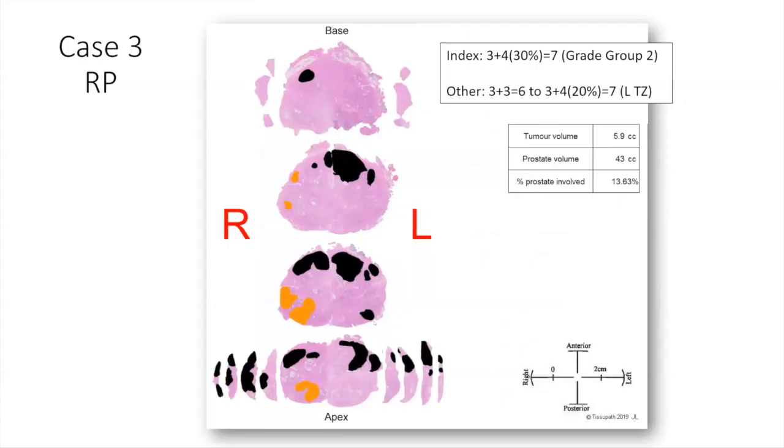You sort of would have expected, given the linearity of that lesion on MRI, that actually it might have been a little larger than that. Yeah, it's also closer to the base. So I wonder if that is actual cancer or not. I think the jury's perhaps still out on that. Andrew? Well, I can tell you it's cancer whether or not it's on the MRI. Yeah. I'm not sure that's the one that correlates to the MR. It's only small as well. It's whether or not you would be picking that up.